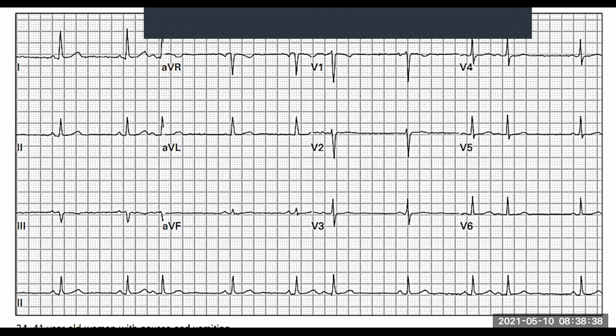So we come to the inferior leads, which are lead 2, lead 3 and AVF. So you've got leads 2, 3, and AVF. What do we see in those leads? Anything abnormal, anything that doesn't strike you as normal? You can pick out any abnormalities, whatever you see.